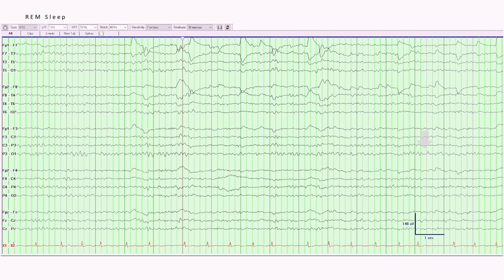And one thing is you'll see it progress from the slow wave sleep typically, which can be helpful for you to recognize it. Another point is that if a patient rapidly enters REM sleep from drowsiness, that can be associated with narcolepsy in the correct clinical setting, but most of the time it's just patients are sleep deprived or other issues, but a formal sleep evaluation may be indicated if there's concern for narcolepsy and you see that.